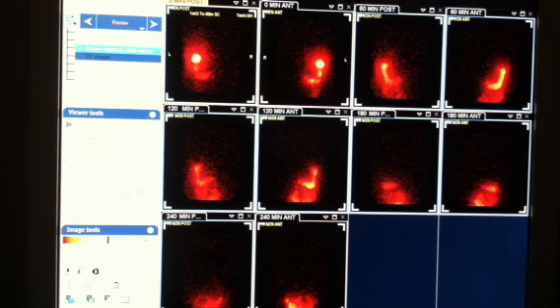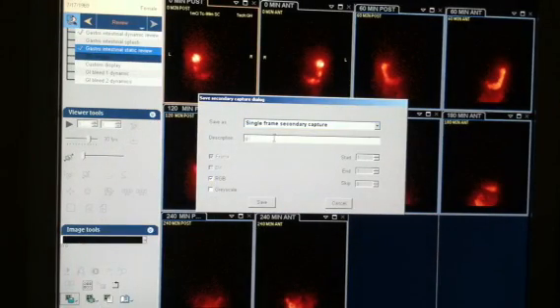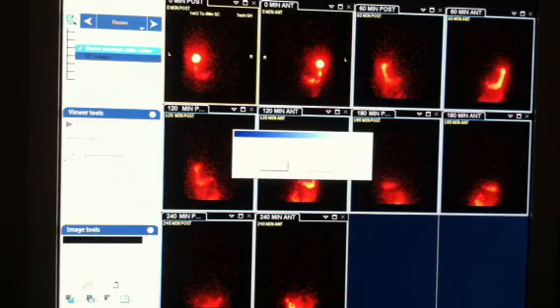And we're going to turn the ticks off right here. And we can save it. Go to this save icon, secondary capture, RGB, GET2, save, and that's it. We hit exit. Do you want to save the images? No, we've got what we need.